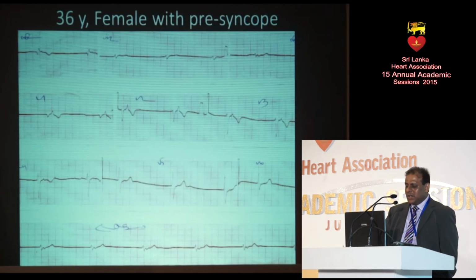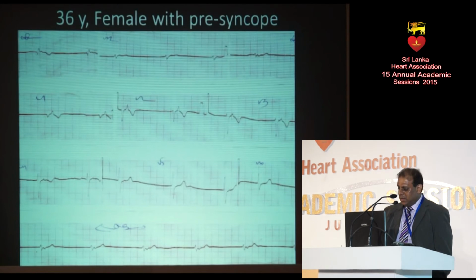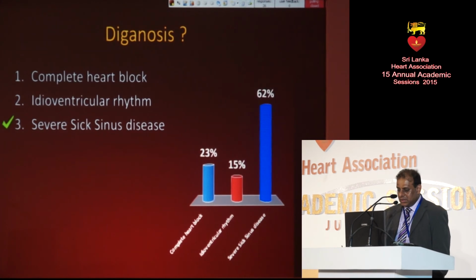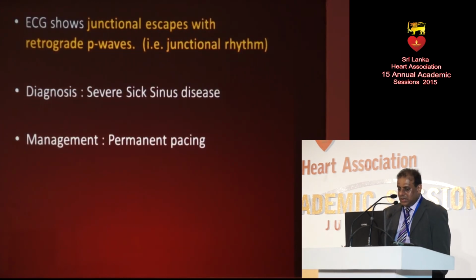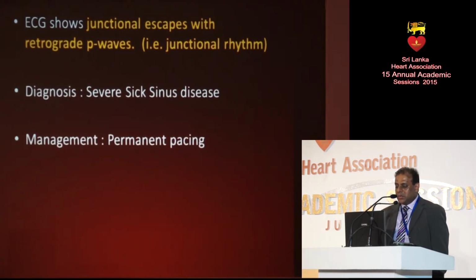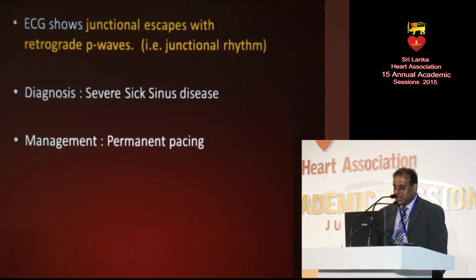Idioventricular rhythm is a ventricular rhythm which is less than 100 beats a minute. I think Evan highlighted that fact during his talk. So idioventricular rhythm doesn't apply here. From a management point of view, this low heart rate patient is presyncopal, so the patient is symptomatic, and we go for permanent pacing here.